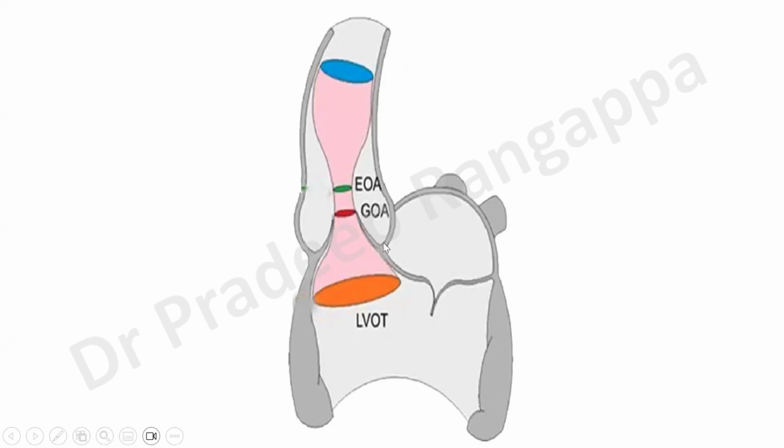The key aspect when we are assessing aortic stenosis in echocardiogram is our understanding of the flow and velocity through this LVOT. If you see this picture, when the blood flows through the LVOT, the velocity may not be very high because the opening is broad, and then the opening tends to get narrowed and the velocity increases.